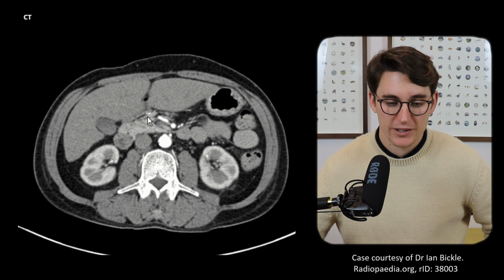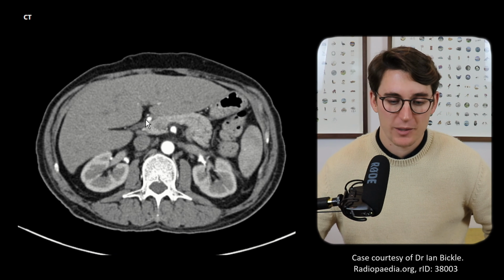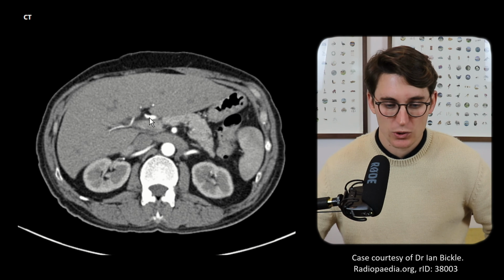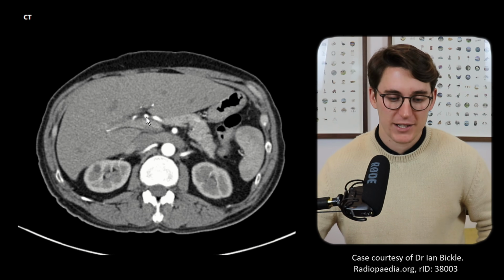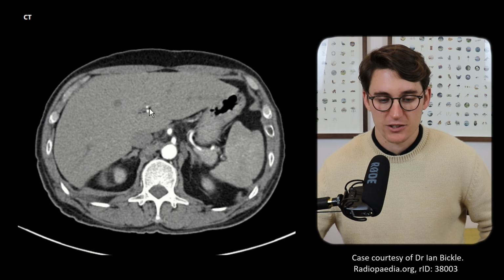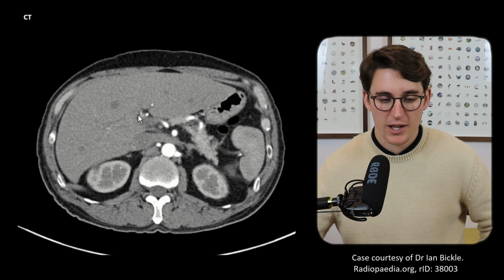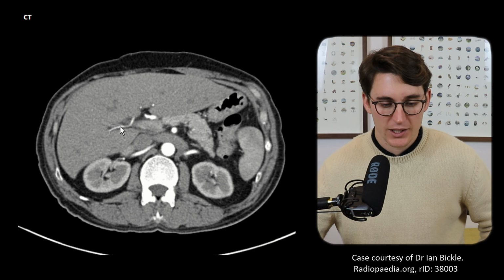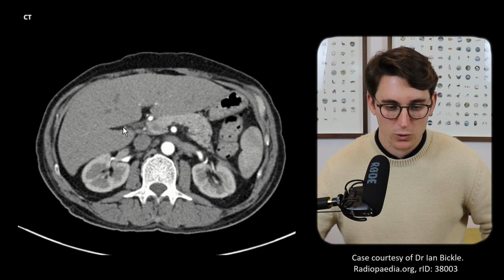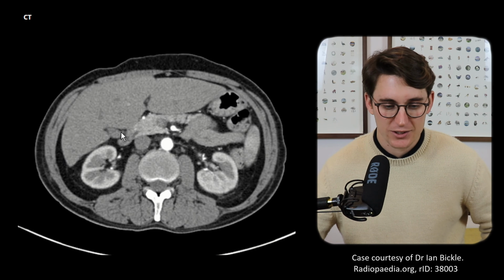Let's follow that gastroduodenal artery back up to our common hepatic artery. Here's our common hepatic artery. There's a short section here, which is our proper hepatic artery, and that proper hepatic artery branches into our right hepatic and our left hepatic arteries there. You see our left coming off and our right going off there. Now if we look closely on the right, we scroll down inferiorly, we can see there a small cystic artery heading towards our gallbladder.